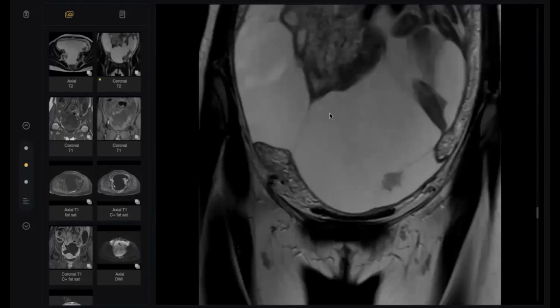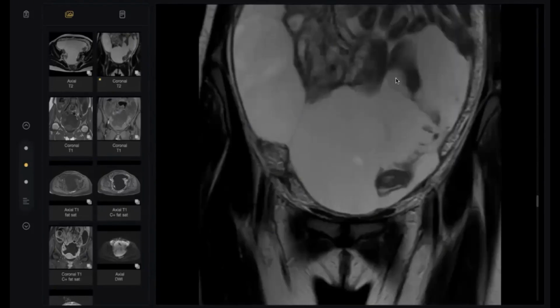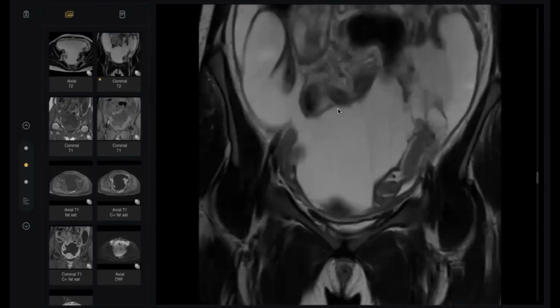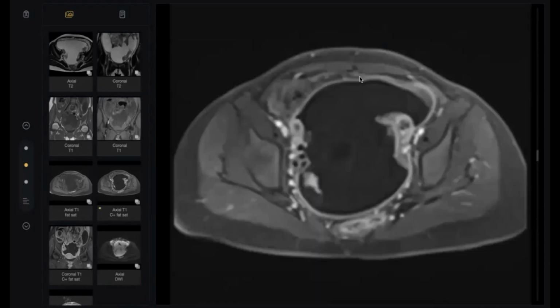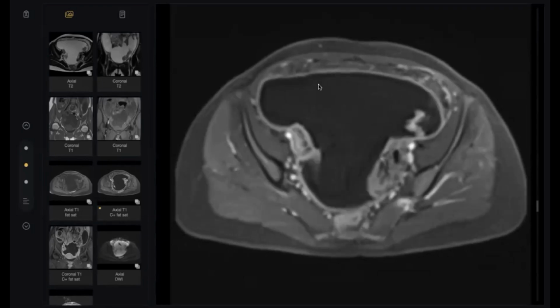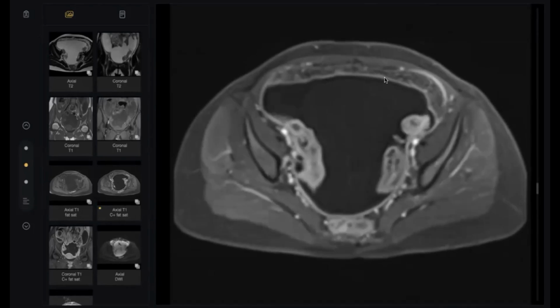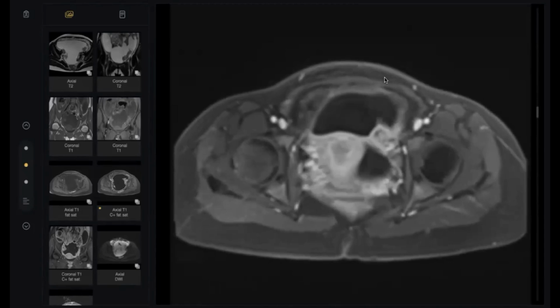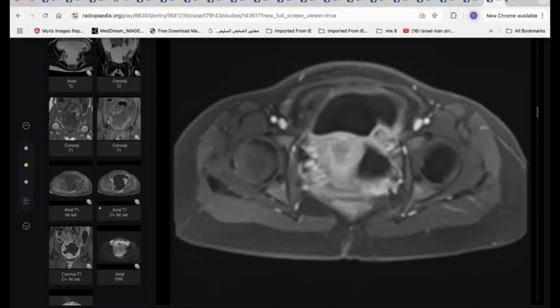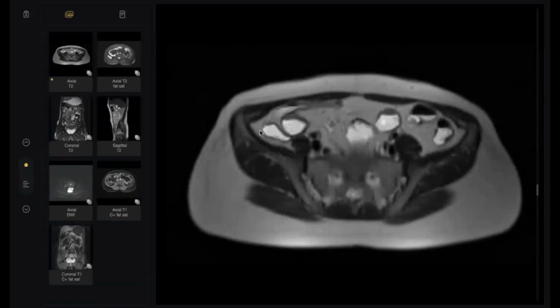Okay, my colleagues, this is too huge to be just a single cyst. This is a peritoneum filled with fluid due to tuberculous inflammatory reaction. And second, look here, especially here in the anterior, except for these areas, the wall is uniform. Anyway, we showed both possibilities, but tuberculosis is the first possibility. Thank you so much, doctor. Next candidate.